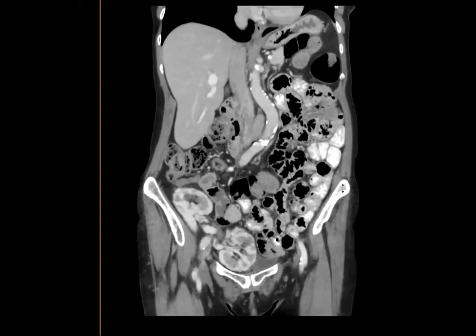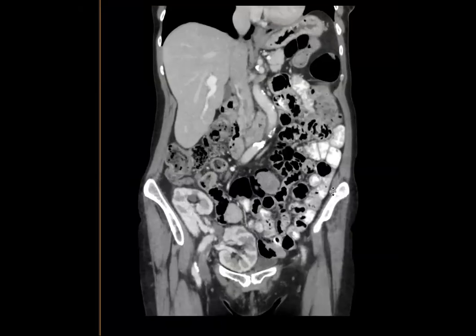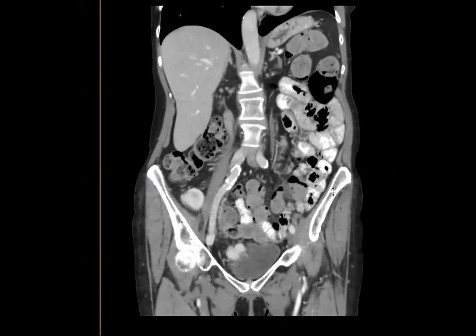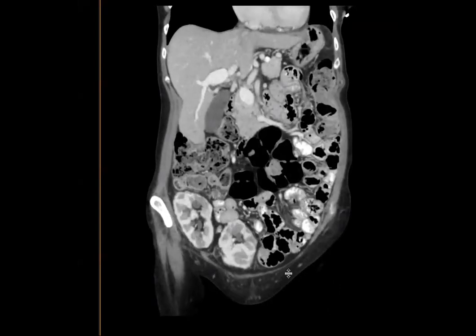Kidneys? Both of the kidneys. Oh, it could be the one that goes this way. Semi-horseshoe, they're both ptotic. Yeah, like in the pelvis. Oh, they are communicating? Yeah. Okay, so what is your consensus?